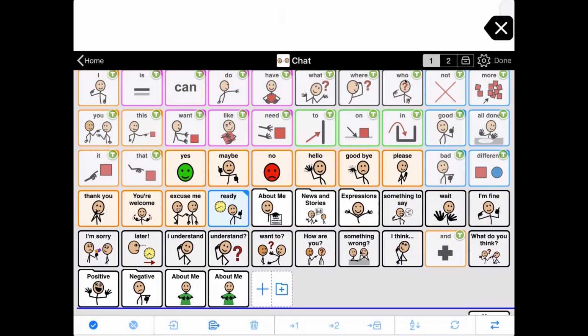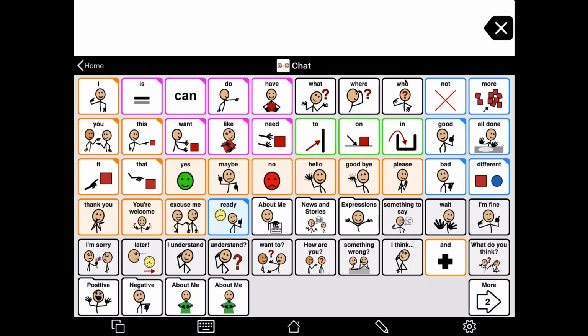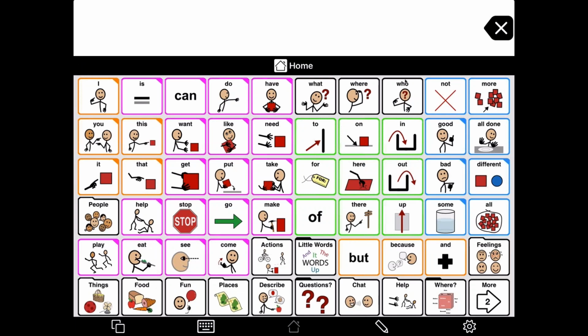Definitely copying buttons is very, very safe between users. Okay, so let's say that you have magically copied all of the buttons and you have watched the other video so that you know the right thing to do with copying folders, and you are now at the point where you want to customize this new vocabulary, taking a look at the new words that you have available to you in the new vocabulary. So there's one thing I wanted to let you know about how to do that.